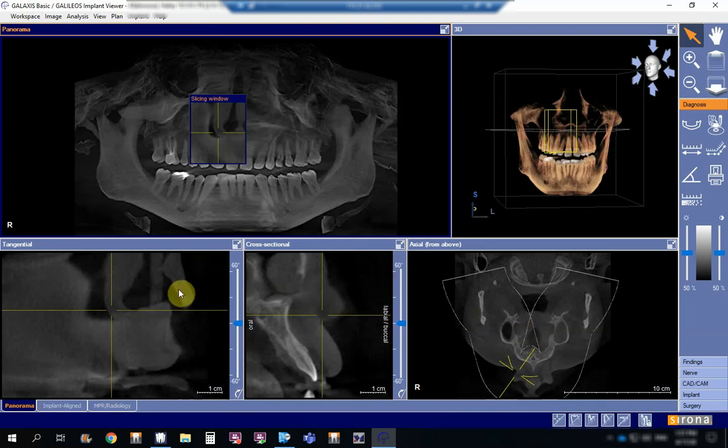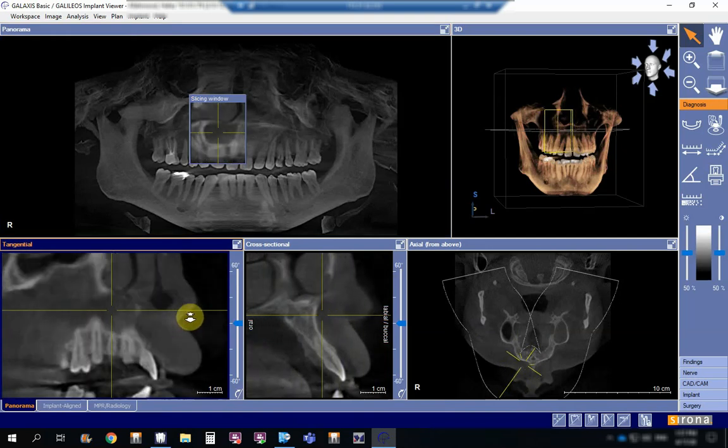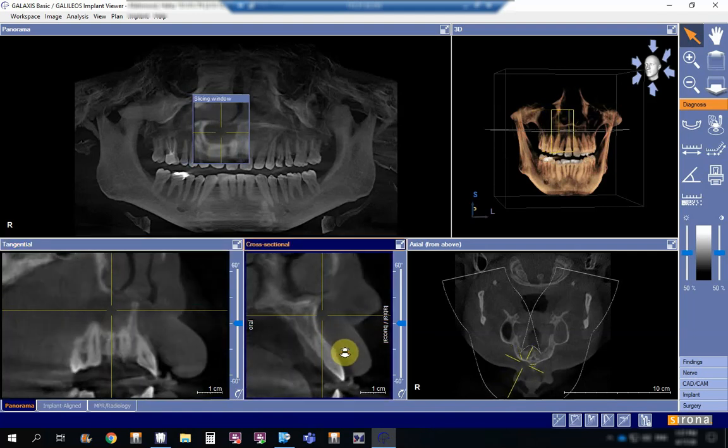For the sagittal plane, you will have only one section, mediolaterally. If you go through the coronal, then you will have one section, which is anterior-posteriorly.